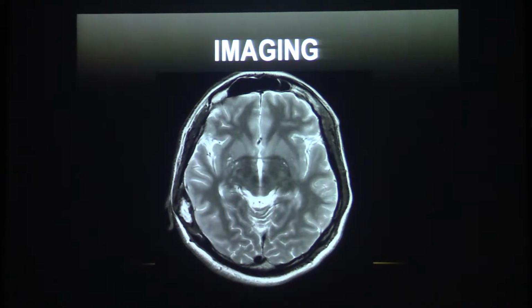So here we can see a T2 weighted image, without contrast media administration. We can see the expansile bone lesion. We can see the intact yet thickened cortex. And we can see within the lesion, in the intraosseous part, a cystic-like component with high signal on T2, correlating with the ground glass opacities we've seen in the CT scan.